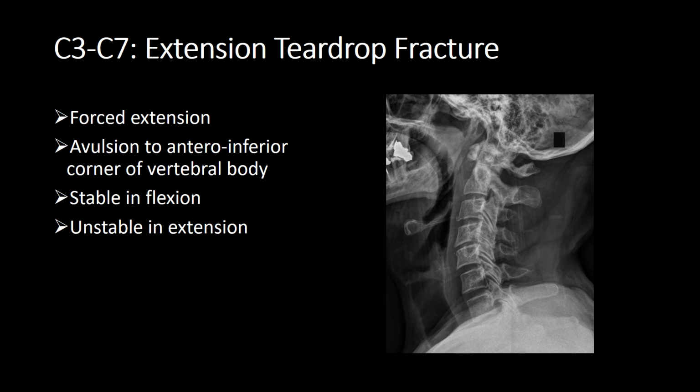Okay, so let's assess this image. A is for adequate. Yep, we've got the base of skull on here. 1, 2, 3, 4, 5, 6, 7. You would want to be able to see T1 in clinical practice, but otherwise we accept this.